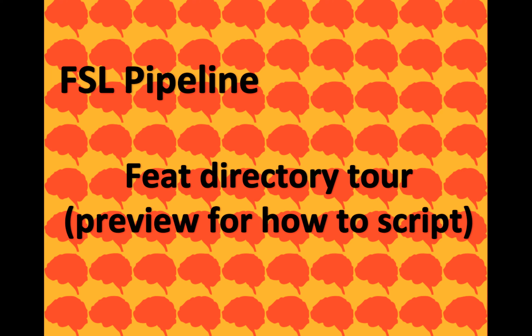Let's see, I'm going to skip over design.min. The design.png, like all the PNG files in here, is going to be great for our QA step. We're going to do the QA after we actually run all the first levels, because it's more efficient to check them all at once. If you're on a Mac, you can just type open design.png. And if you're in Linux, I always use, I think it's display. I have no idea if that's the greatest option or not. Anyway, if you need to review your design matrix, or something's amiss with your results and you think you messed something up in the design matrix, you can have a look.